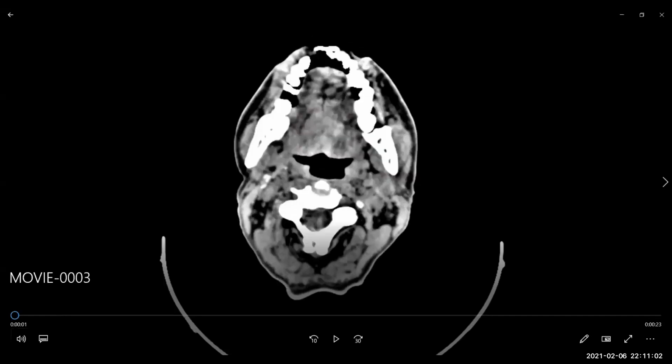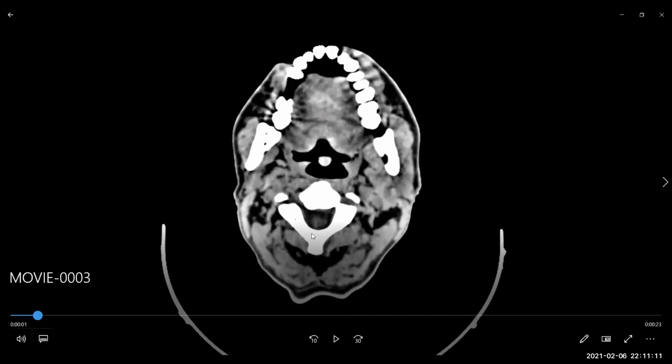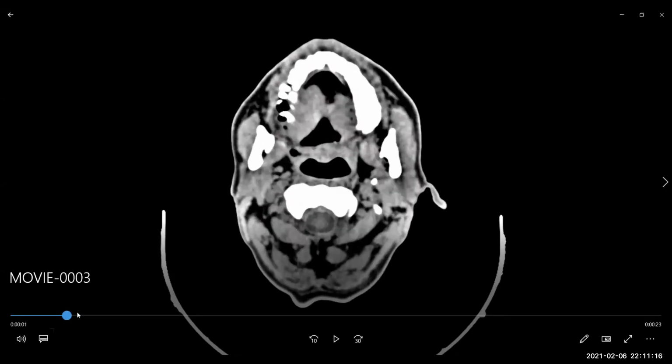Patient has a known case of lymphoma. Can you ask me the control if you want to? Yeah, this is a known case of lymphoma. I have been given a CT scan. Now presented with altered sensorium.